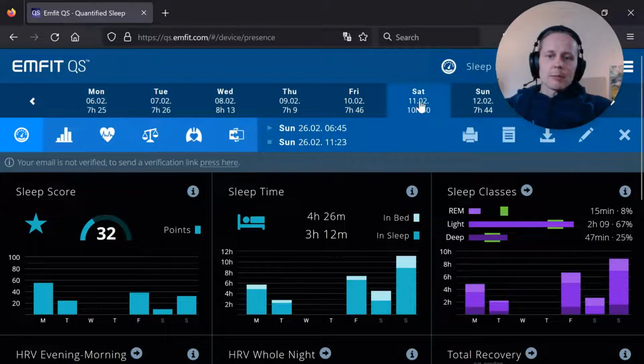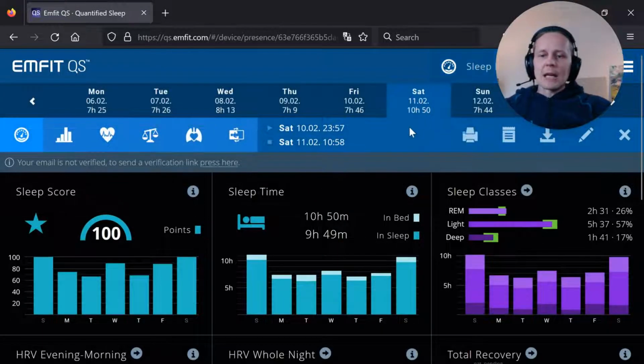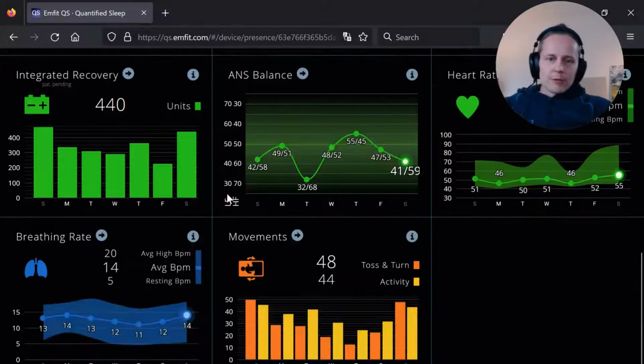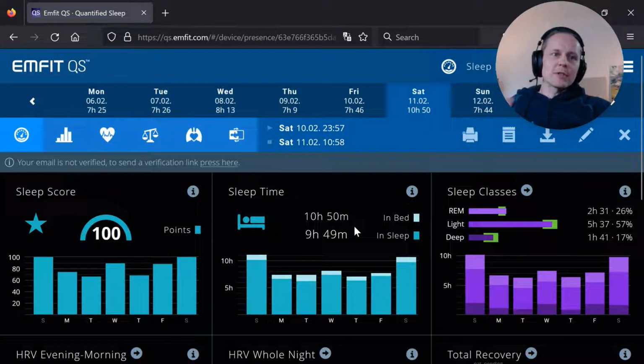Now I will, for example, click the Saturday, 11th of February. The dashboard will show this Saturday that I selected on the last one, and then it will show 1 week backwards. So we can look at the results, and there is quite a bit of different kinds of results. In this video, I will be concentrating on the main variables that are most important.